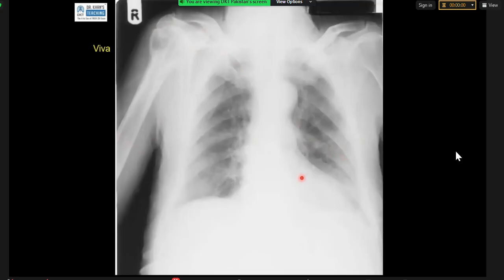Yes, I can see that in comparison with the other left humerus, there is cortical thickening involving the proximal part of the right humerus, and also increased trabeculation of the proximal right humerus, and cortical periosteal reaction is noted.